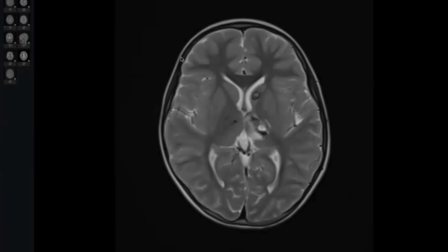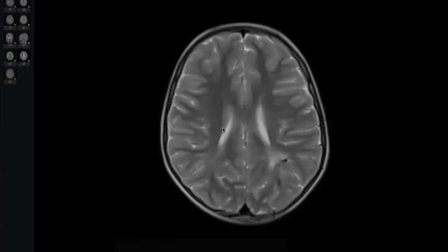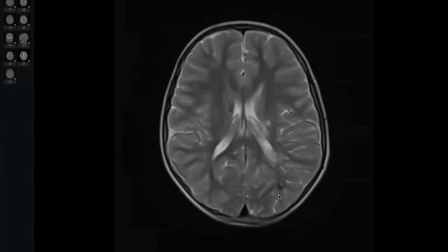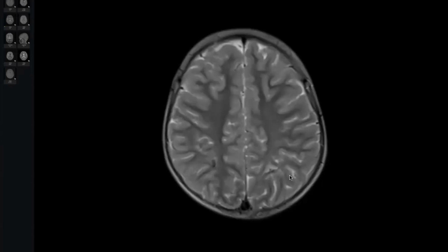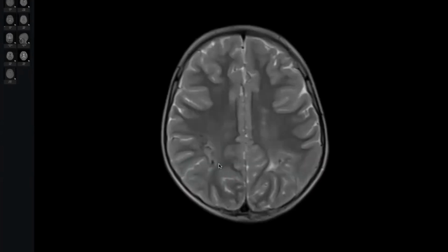The lesion, by the way, this is not a tiger eye. The lesion has a central high T2 density and a peripheral dark ring. Counting the lesions: 1, 2, 3, 4, 5, 6. So what are you worried about? Calcification. Okay, calcification. What is the next sequence you want?